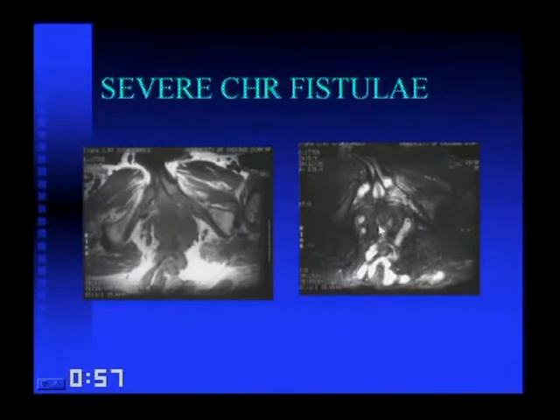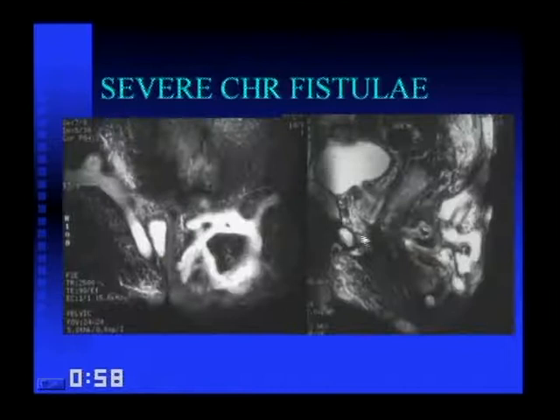Here you can see the origin of the perianal tract. It goes posteriorly and then just starts branching everywhere throughout the entire subcutaneous gluteal fat, coming here into the right ischiorectal fossa as well. This is the same patient. Here was the sagittal. You can see how it goes posteriorly and is just branching everywhere. And this was a coronal posteriorly through the buttocks. And you can see just how extensive all these fistulous tracts were. So, like I said, it helps with the surgical planning.